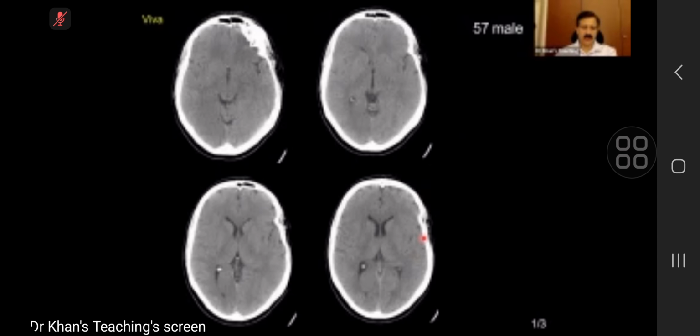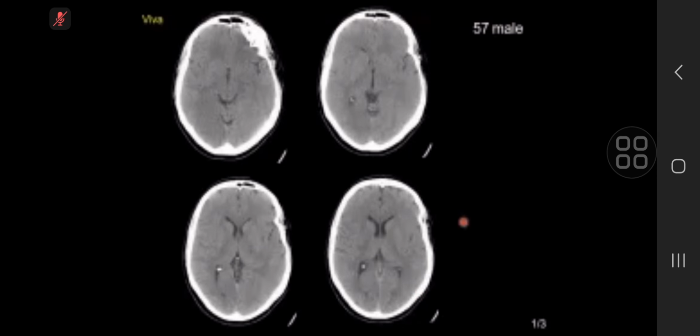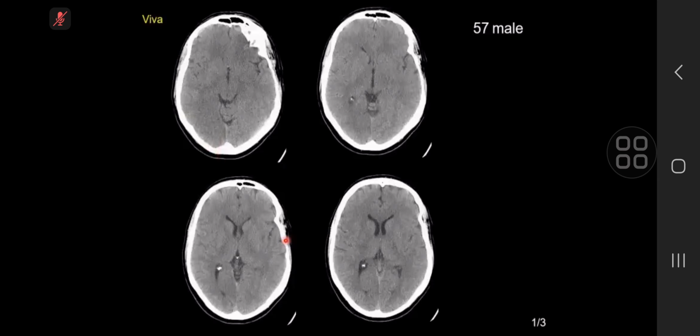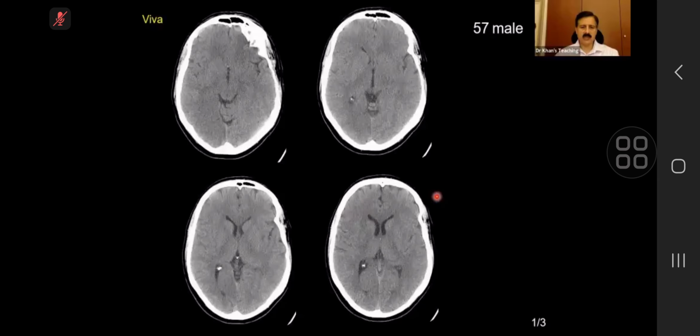Is there an acute infarction? This is a classical exam case. So there is loss of the normal sulcus, there's sulcus effacement on the left cerebral hemisphere. You mean to say, okay, left, somewhere here? The left side. Okay, yeah. Left. No, don't worry about this. Anything else? Look at the occipital lobes.